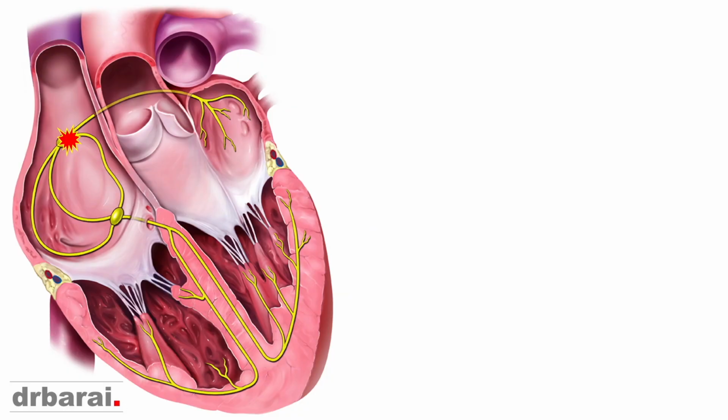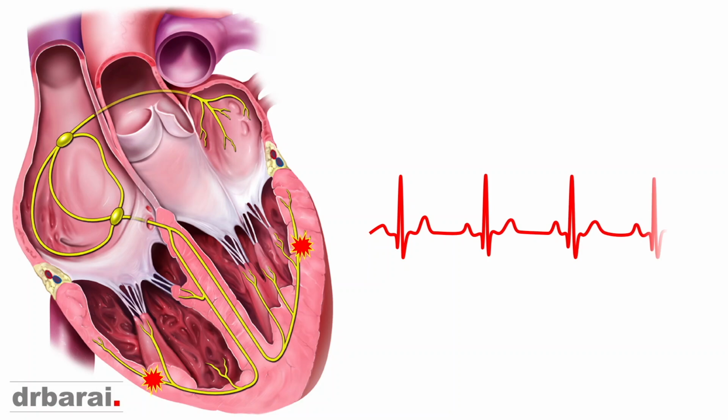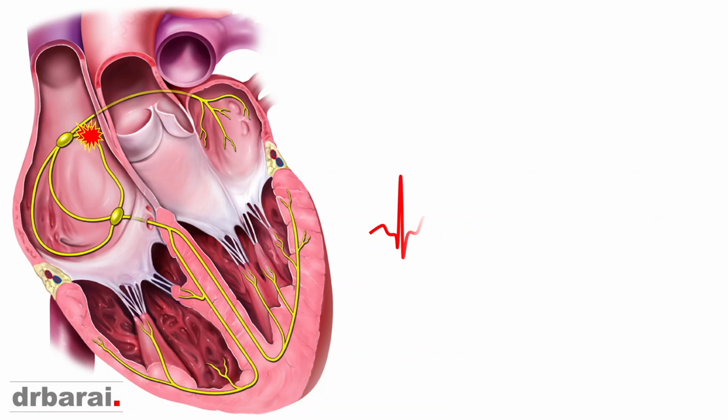So tell us a little bit more about this step one of the Brugada criteria. You mentioned the RS wave and you also mentioned concordance. Tell us a little bit more about it. Look, this very first step of the Brugada criteria is very important. To understand, we need to understand a little basics. If you look at leads V1 to V6, you will see a positive wave, which is the R wave, and a negative wave, which is most of the time the S wave, but it can be a Q wave as well.